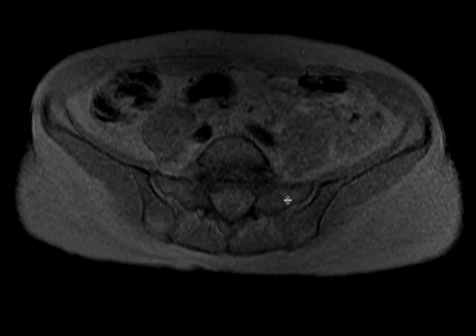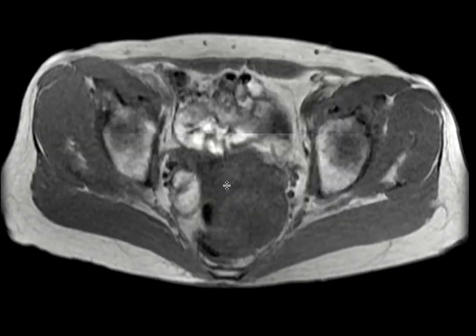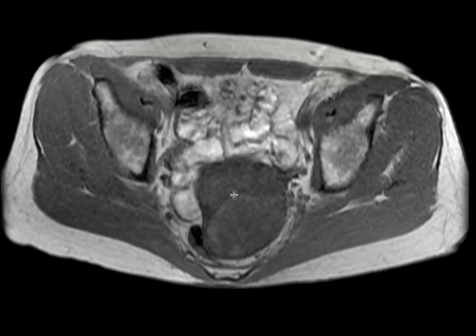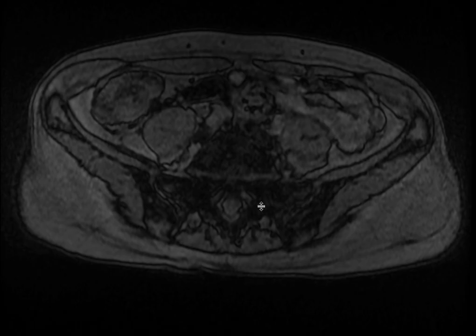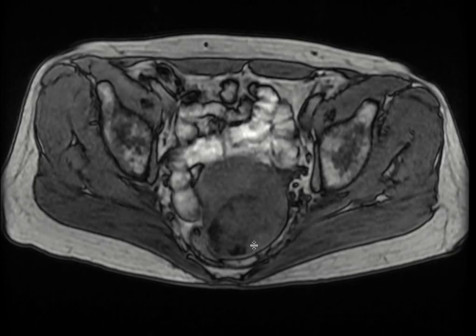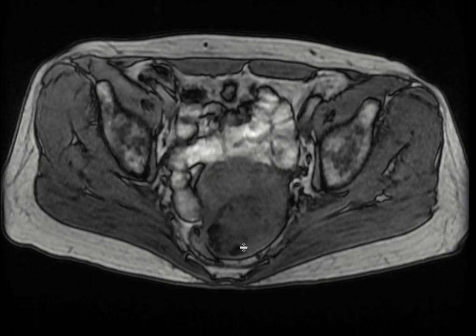Now, this patient ended up also getting an MRI of the pelvis, and you can see here's the in-phase image of the fibroid back here. And when we go to the opposed phase imaging, we can see that there are actually areas of dropout within this fibroid posteriorly. And so that's consistent with intravoxel fat deposition. So this is a patient who has a lipoleiomyoma.